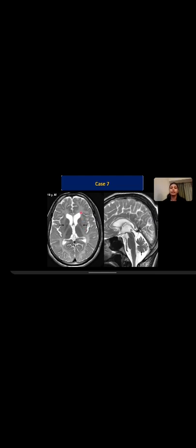Yes, very good. So there is a significant atrophy of the basal ganglia, and in later stages, it may appear that the putamina are involved, and may look like disappearing basal ganglia. This basal ganglia atrophy is out of proportion to the hypomyelination.